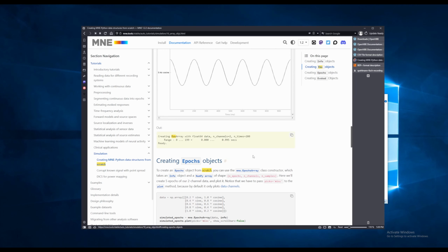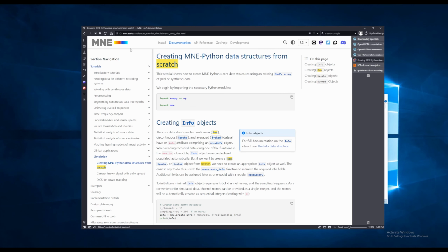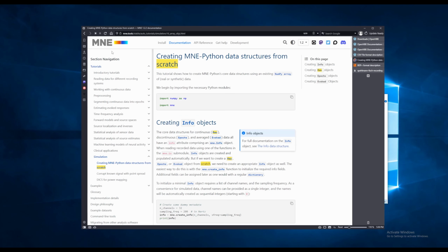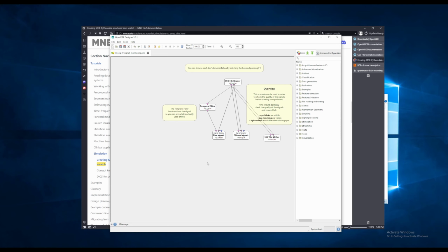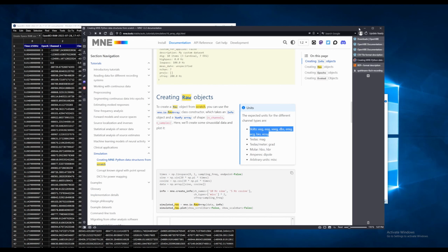And from there, you can add annotations and epochs, but the heart and soul of it doesn't really change between all of these formats and all these different extensions. As long as you have access to your samples and you know your sampling rate and you know what unit it's been recorded at, because, for example, MNE prefers volts, whereas OpenVibe prefers microvolts, which the difference is only a decimal point, but it's something you need to be aware of. But the focus of this video is on OpenVibe, and we're going to make our own file from scratch now.